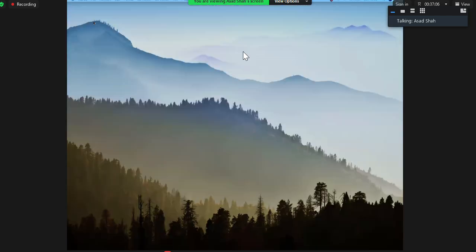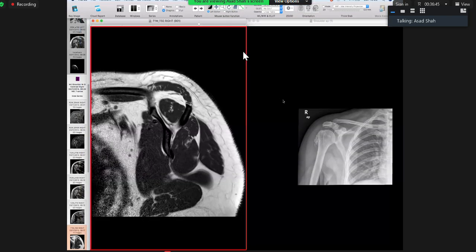Okay, I'll put the next case up for you. Thank you. So yeah, that was gout. All right, so prisoners, elderly, gout can present in different forms.